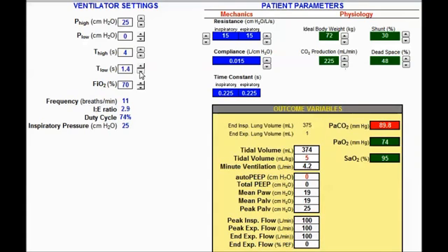Now I'm just going to go down at the 0.2 again and change my compliance. So if my compliance changes, well, I'll get back in the range. So I was targeting 4 to 6 cc's, and now my compliance changes. Here's my next compliance value. I'm going to change it to 30. I'm still in the safe range, quite a bit of auto PEEP here.